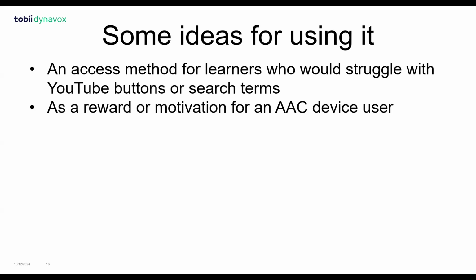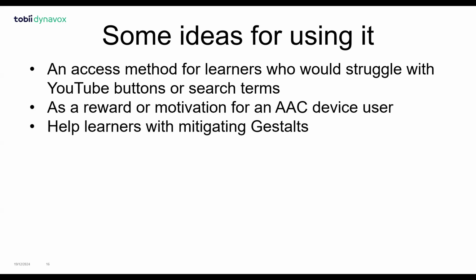You know, there are some people, and I'm not saying this is for everybody at all. Some people it could be a distraction, but for some people it can be the very thing that makes them want to engage with their AAC device and then move on from the videos to actually using it for communication. So use that carefully, but think how it might work for your specific user. However, as I said, we want to start thinking about using this in different ways beyond simply an access method or rewarding or motivation.